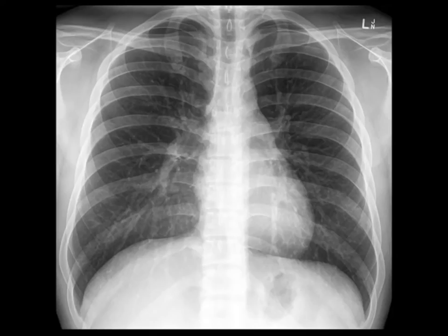through how I would present a normal one to a colleague. This is an ideal scenario where we assume that we have the patient's information and we know what kind of a radiograph it is. This is an upright PA chest film of Mr. Duffy, taken on the 1st of January this year. Exposure is adequate, the patient is not rotated and there is no motion blurring. Airway is central and patent, there are no fractures, lesions or defects visible in the bones.